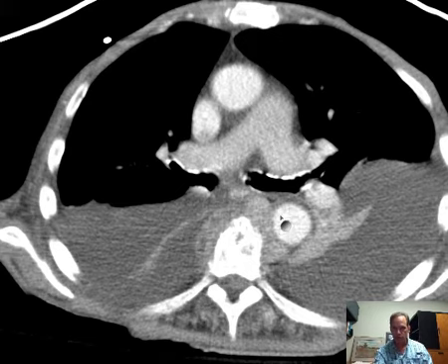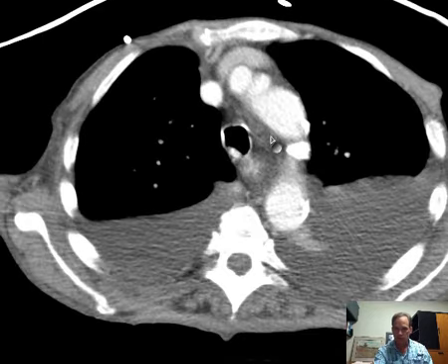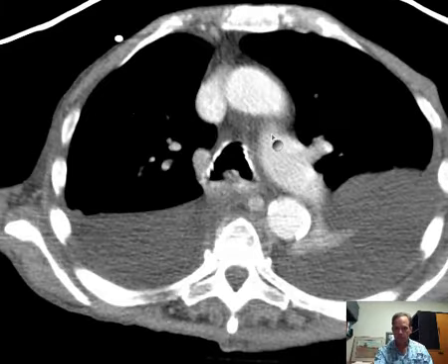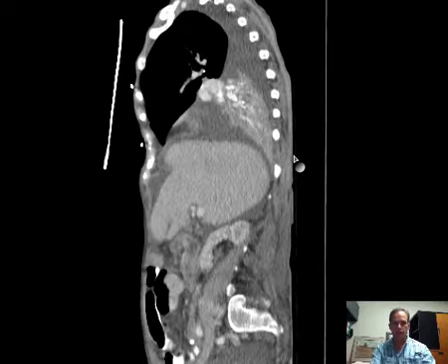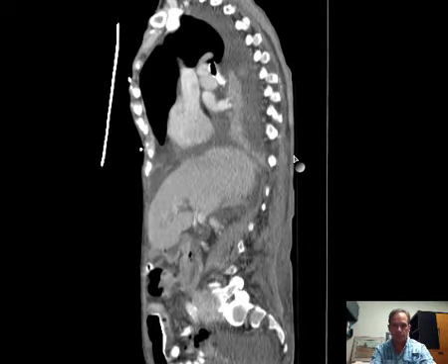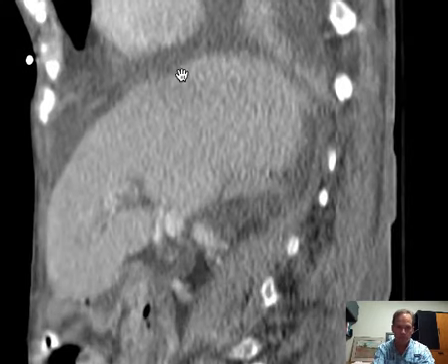This is the aortic arch. You don't see that it's an arch because this is ascending and this is descending. But if we go up higher, you see, sure enough, it's an arch. So let's look at that a little differently in the sagittal plane. See how different things might look there. And let me get that down into view.